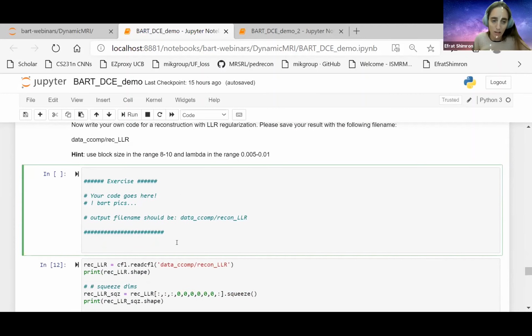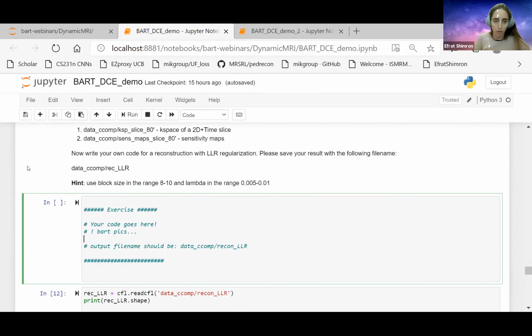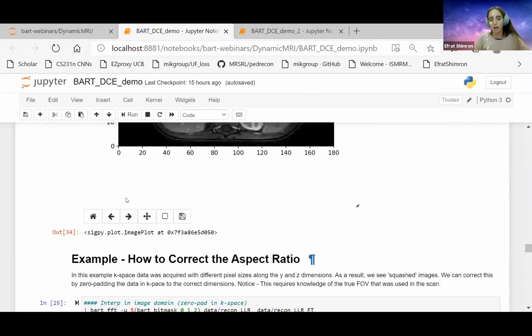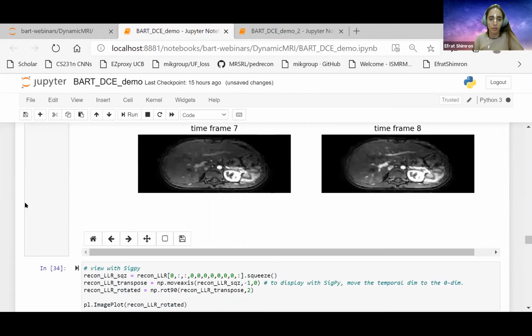It's only a single command, and it's very, very similar to the command that we have seen before for the previous data set. And of course, you can find it up here. So please go ahead and do that if you're interested.